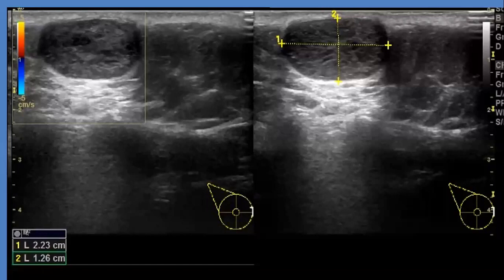It is a skin lesion as it's compressing the breast parenchyma posterior to it. Okay, so why is it a skin lesion? The capsule of the parenchyma could be appreciated posterior to this lesion.